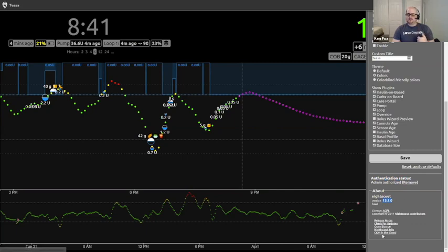get a bunch of these little links that most people don't look for, but they're here. So the Facebook group is CGM in the Cloud. It's right there at the bottom. The Nightscout webpage, where all the information is, Nightscout info. And then the check for updates button will walk you through how to update Nightscout. And then just above that, the very first one is release notes. If you want to see what's been going on on GitHub, it'll take you to the GitHub page, and you can look at some of the recent changes.